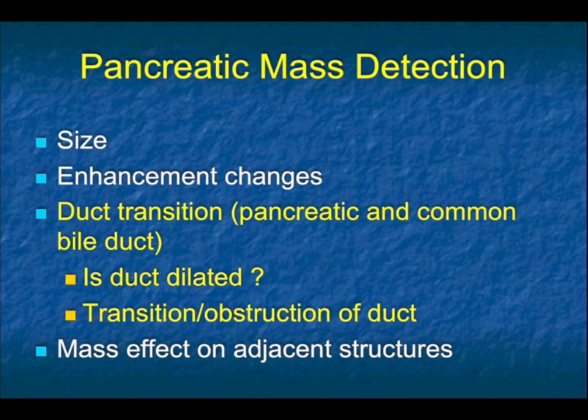Now, last time we spoke about the importance of looking for tumors. We spoke about how, obviously, it's easy to see large masses. Harder masses are the smaller ones typically. We look for things like textural change to see smaller tumors. We look for enhancement changes, of course. Pancreatic adenocarcinoma is typically hypovascular, whereas neuroendocrine tumors are hypervascular, so we look for changes in that enhancement. We spoke about how cinematic rendering can be helpful.